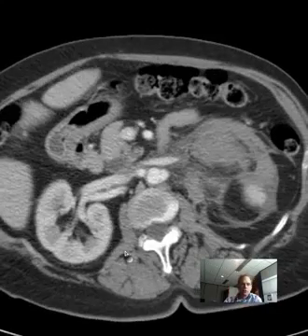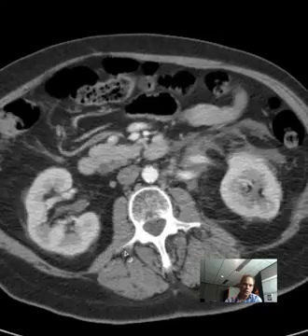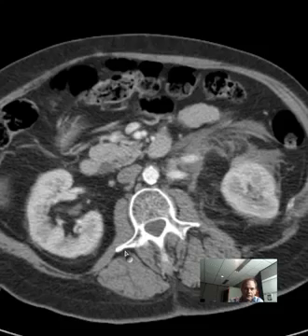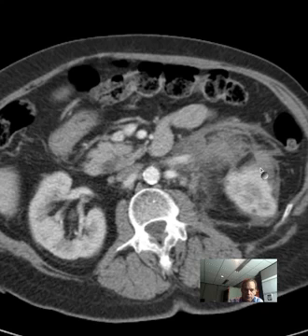So what has happened here? Well, if we go up, we're going upward here. Is the kidney the problem? Is this a renal process or something else? It doesn't look like the kidney itself is really in bad shape. It has some of this stuff around it, but the margin of the kidney looks okay. I don't see a renal mass. Tiny little sub-centimeter cysts. What's defined here is the perirenal fascia, and you see it thin and normal here, so whatever's going on here is infiltrating the perirenal fascia.